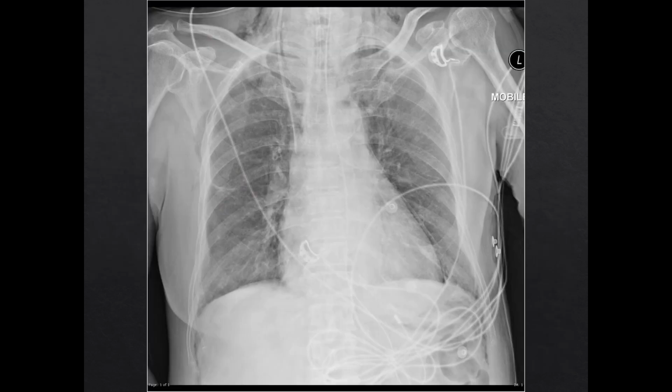So, how do we diagnose pneumomediastinum on chest x-ray? These findings can sometimes be pretty subtle, especially some that I'm going to show you a little bit later. But essentially what we're looking for is evidence of air trapped within the mediastinum, air trapped around the heart and the great vessels and that kind of thing.